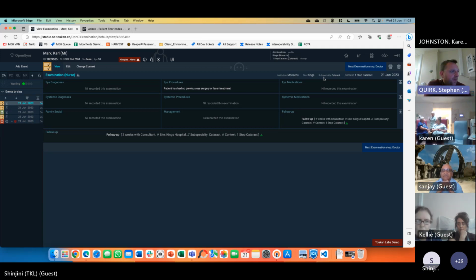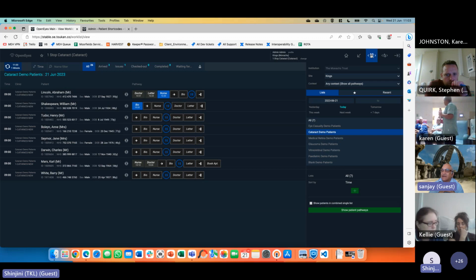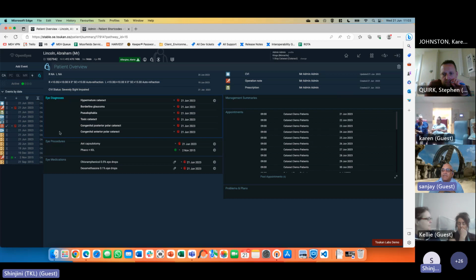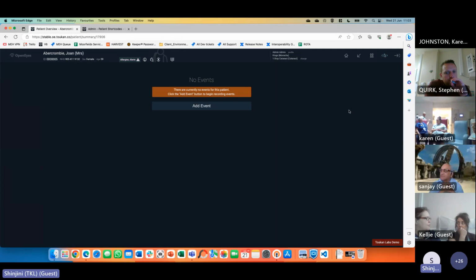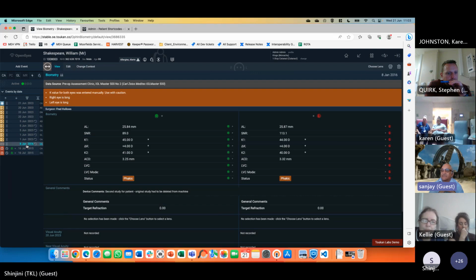But biometries come in. Unfortunately, I'm pretty sure on this test system we won't have a biometry to import. I should show you how it's imported and shown. Do you have one which is already imported? Oh, there we go.